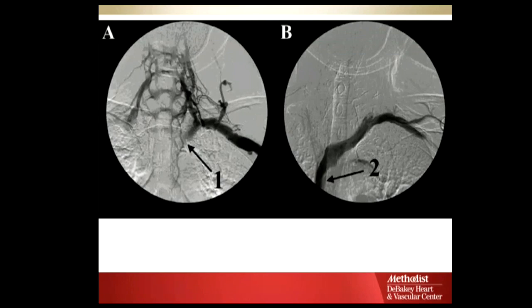Second thing is, if we showed you, it would be flowing in that kind of direction. We can tell that because of the collateral pathway. You just don't get arterial collaterals that look anything like that. So what's wrong with it? Dye comes up, goes all the way around here, and drains back down into the heart. It's occluded. It's an occluded left innominate vein.